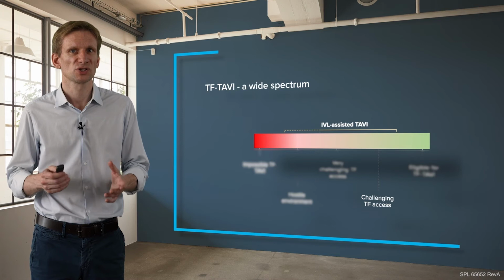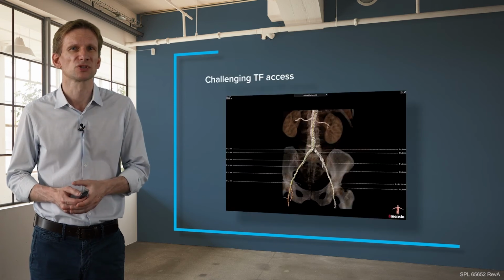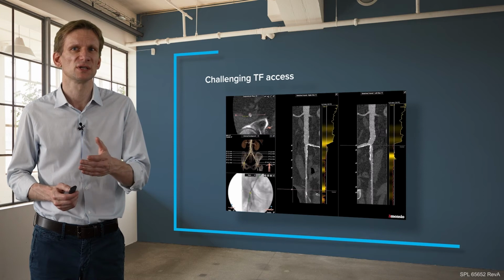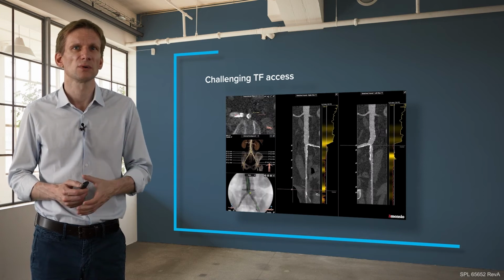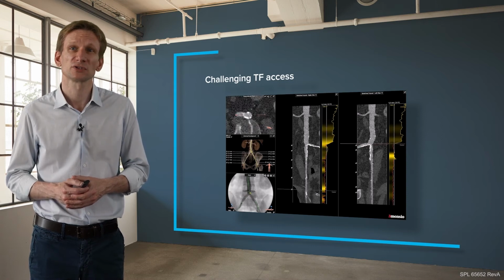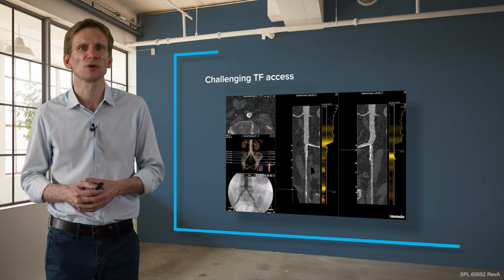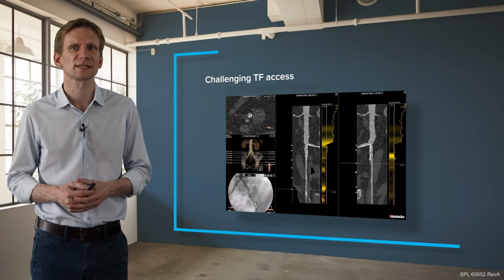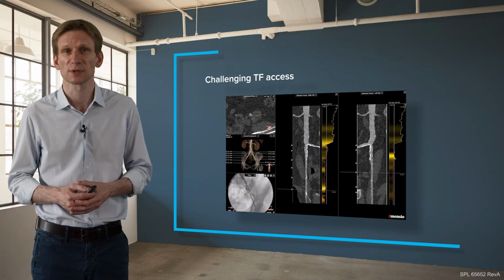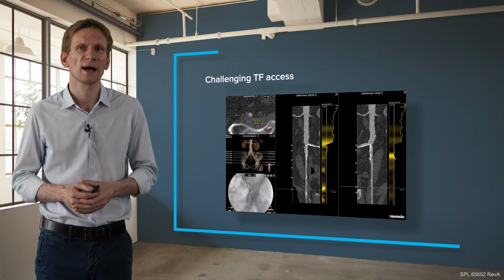So here again, we start with our good pre-procedural CT analysis. You immediately see most of the calcium there at the common iliacs on both sides. We start first, as you can see, on the left leg. So I would say again 270-degree calcifications here, and here circumferential 360-degree calcification, with luminal diameters of close to 3.4 millimeters, so rather small of course, but still not unacceptable, and the access site looks really good in this particular case. So we only have that problem mainly on the common iliac. Then we move to the right common iliac.